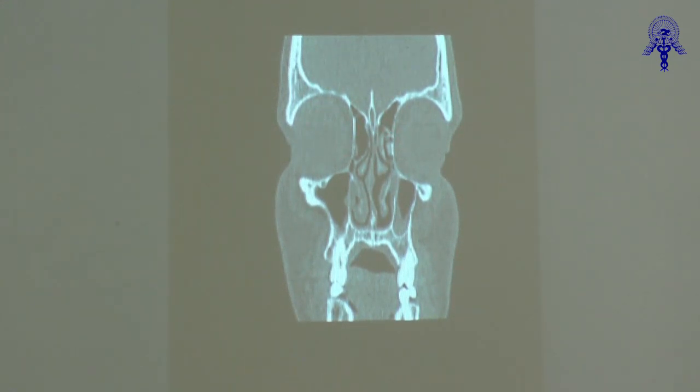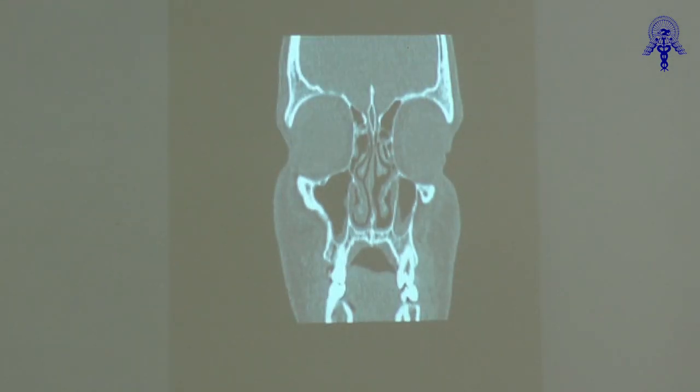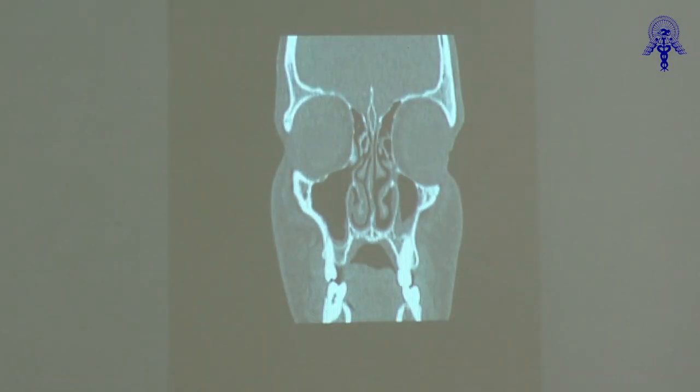And now we cannot see the frontal, because frontal sinus is anterior to the middle turbinate attachment and to the osteomeatal complex area. This is also important to understand during your surgery and practice, that frontal sinus is not going like this. It's like this, and it comes to the front. So then we would go further posterior to see the attachment of the middle turbinate, and this is the first part of the middle turbinate.